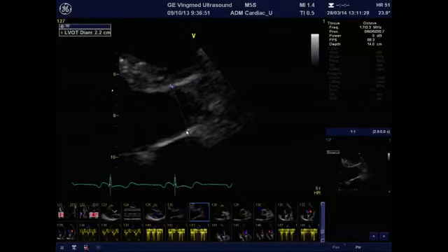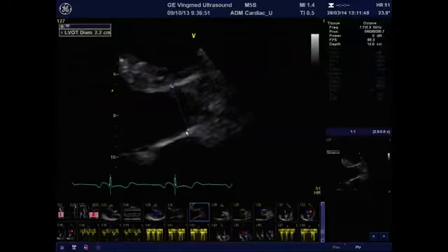It's really important to measure just underneath the prosthesis ring and not to mistake the inner edge of the prosthesis for the left ventricular outflow tract dimension. In fact, like I said, you should measure it just underneath the prosthesis. And it's really important to know that you cannot substitute the size of the prosthesis for the LVOT diameter because it's not a validated method.